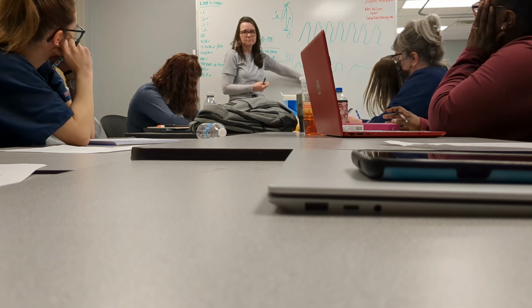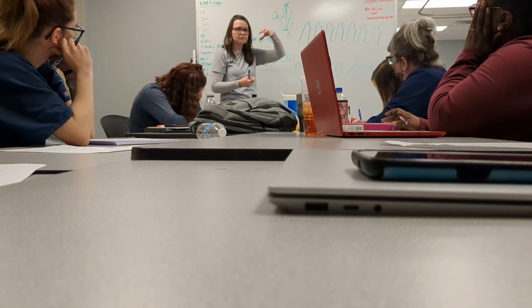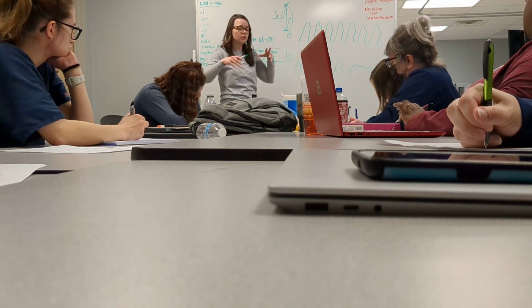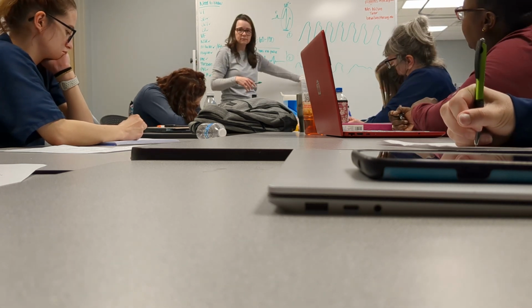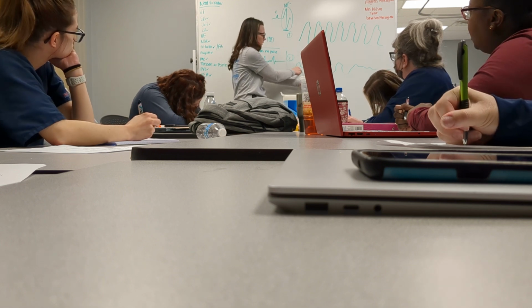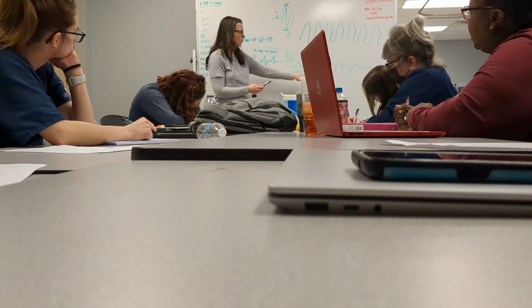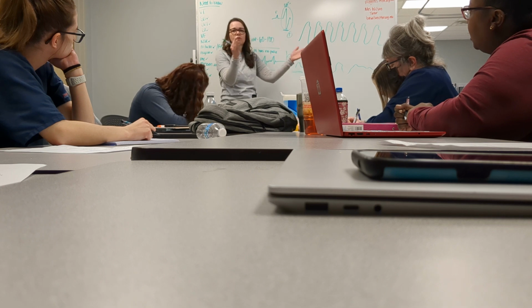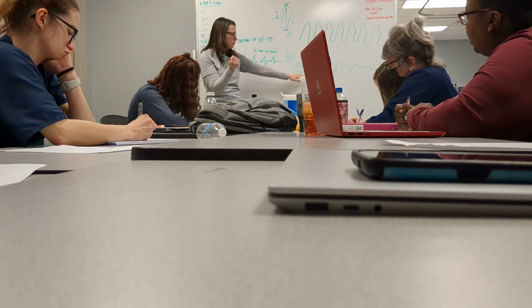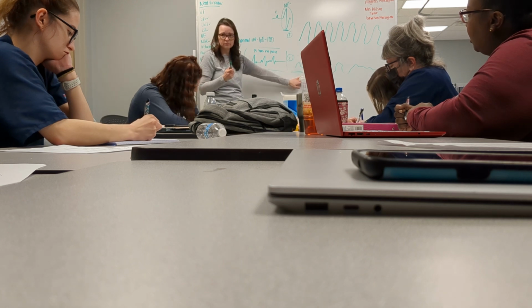What is this? VFib, remember? Fibrillation, just doing this, unorganized. Fibrillation is always unorganized. This, DED, dead. You are not gonna have an alive patient in VFib because nothing is organized, nothing is closing to get blood out to your heart. This patient is cold, they don't have a pulse.